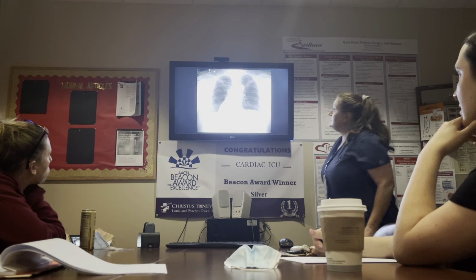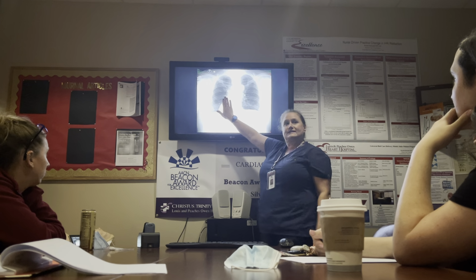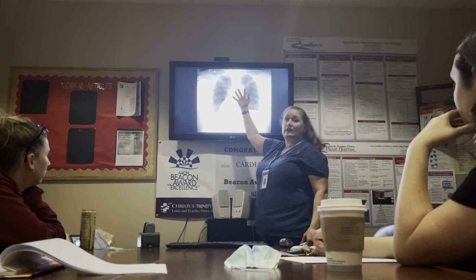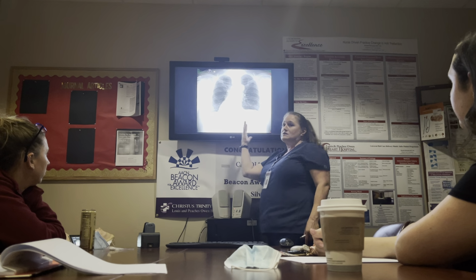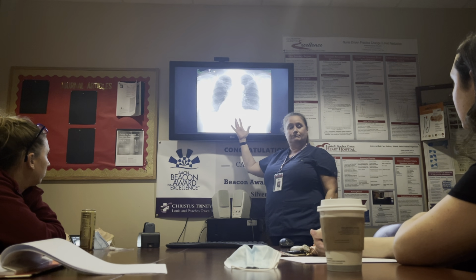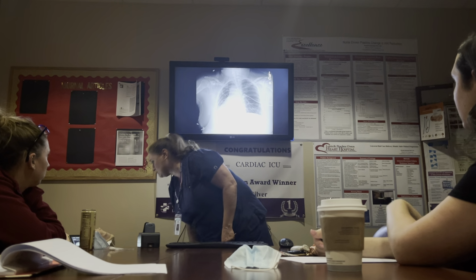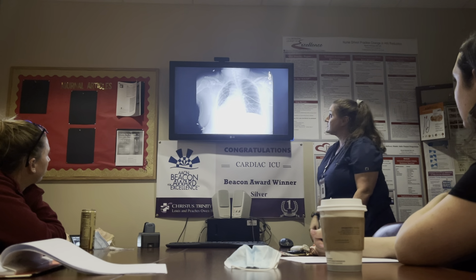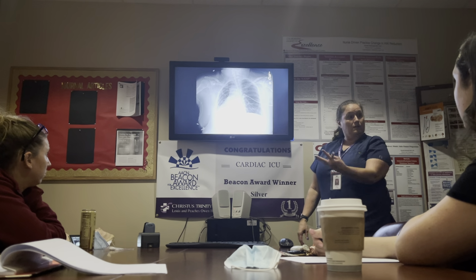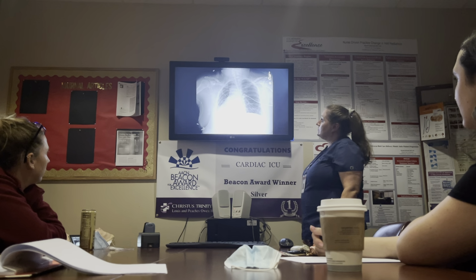All right. There's another picture of dextrocardia. So the heart is actually on this side, this aorta. Sometimes you'll have everything flipped. Sometimes the aorta will stay on this side and the heart will be flipped. Sometimes you'll see that your tummy and everything else are flipped, and it just has to do with genetics and the birth side of things, before birth. Another patient of mine that had dextrocardia, it was always funky to have to listen to her heart on the right side of her chest. But yeah, that's what those look like, okay?